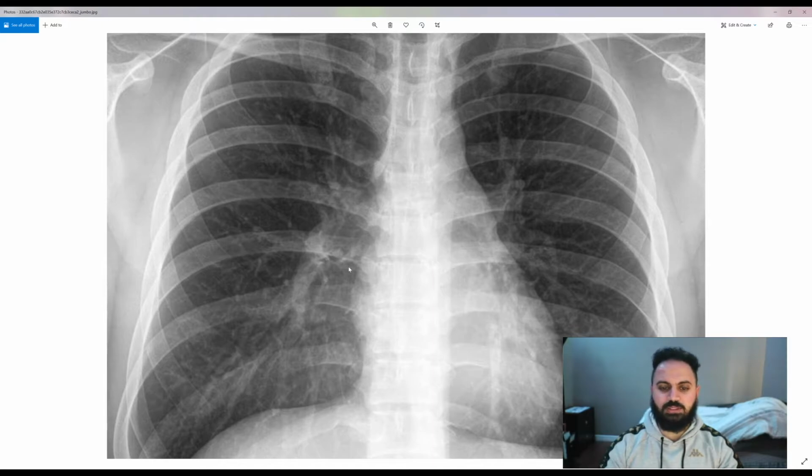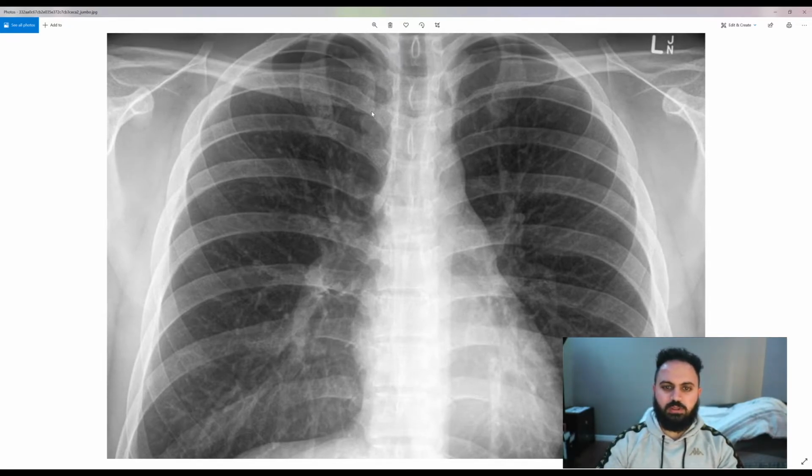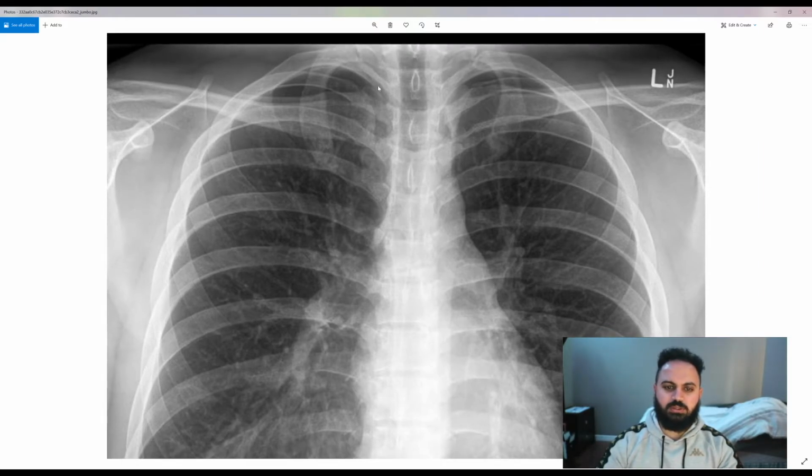within the lung it might actually be located, and especially with the diaphragms as well, that'll give you a hint to where the consolidation might be located. So making sure that those borders are nice and sharp. Paratracheal lines, again, lymphadenopathy, etc., to make sure that those are nice and clear.